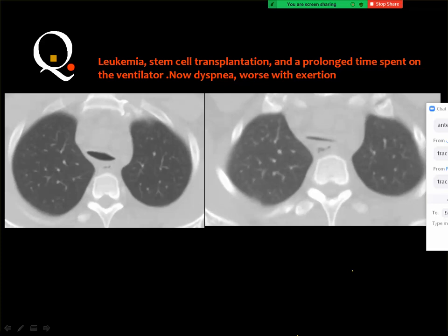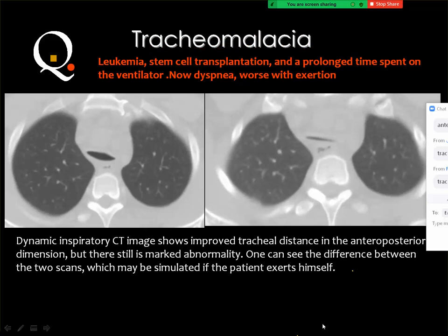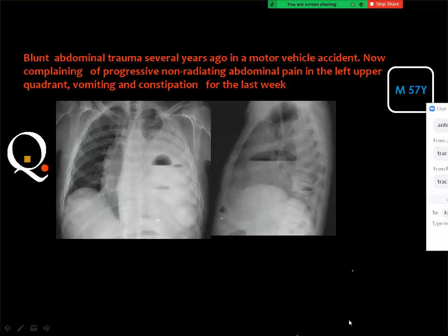Yes, this is right. Tracheomalacia, because you see the trachea has a good lumen, but it is not rounded as we used to see. And at that time, maybe during expiration, you got almost total obliteration of the tracheal lumen, and this is diagnostic of tracheomalacia. You diagnose tracheal stenosis if it persists very narrow in all the sections. When it changes its caliber, then you think of tracheomalacia.